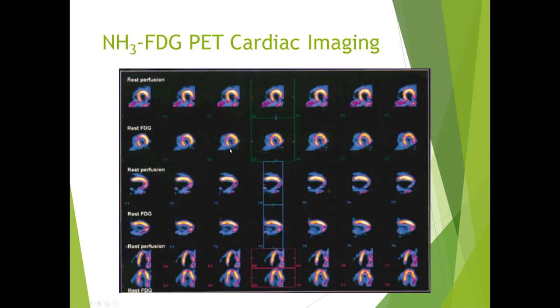Now you may notice that there is a difference in pattern of FDG uptake. The previous scan only seemed to show FDG uptake in the areas of ischemia and viability, but this actually shows FDG uptake in the areas that are perfused.